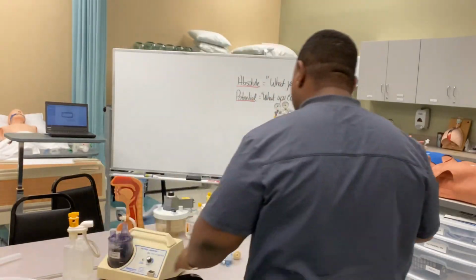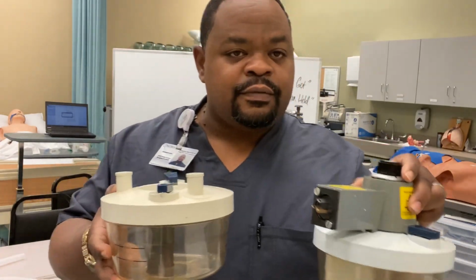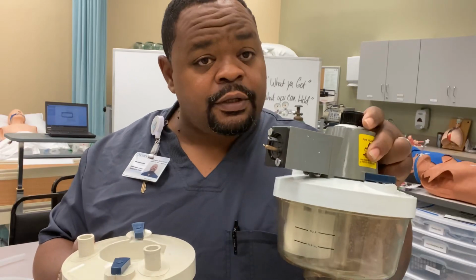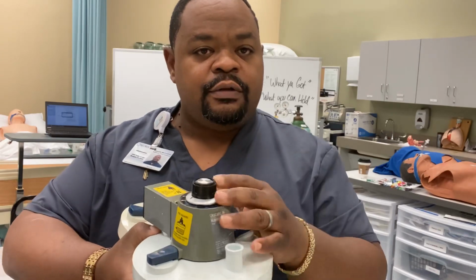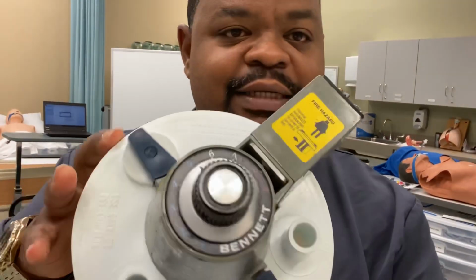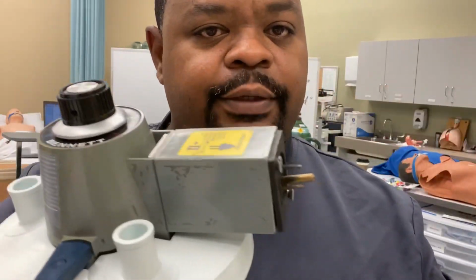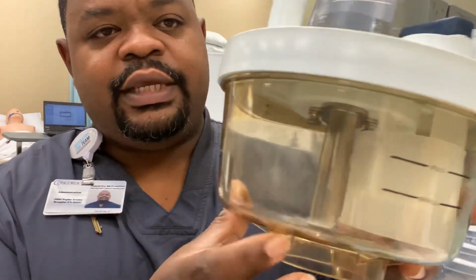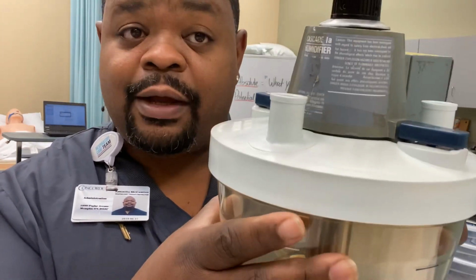All right, Passover humidifier. This one is called a cascade humidifier. Notice the cascade is simply a Passover humidifier with heat, right? The cascade has what's called a tower. This is the tower. You'll notice that on the tower you have a dial that tells you how much heat you want to put on it, right? How hot it is. And this is the power source here. The plug will come off of here, plug up, and these little tubes down in here will heat up and heat the water, make it hot, right? And then as it passes over, it's hot.